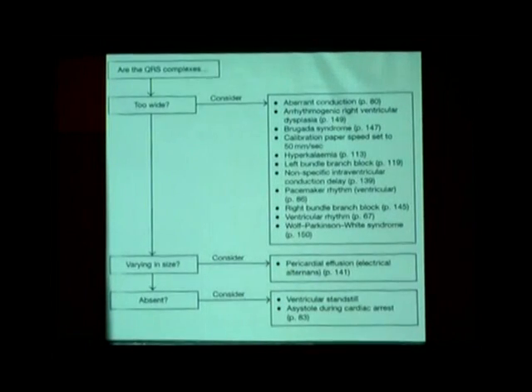As soon as you see the ECG, you can see the number. Then the next abnormality of the QRS is that it is wide. What is the normal duration of QRS? 0.08 second. So whenever the QRS is wide, there are two important differential diagnoses: whether the QRS is wide because of initial delay or because of terminal delay. If it is wide because of initial delay, it is WPW syndrome or anomalous Kent pathway, usually associated with a short PR interval. If it is wide because of terminal delay, it is bundle branch block. That is the commonest diagnosis.